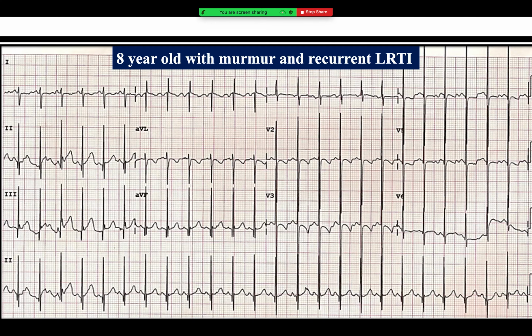It is, of course, congenital heart disease. Isn't it? It is sinus tachycardia. We can see the P waves in front of all of those complexes. Axis-wise, right axis deviation. How are these P waves? Because the patient is in tachycardia, it can be a little bit difficult to say, but right atrial enlargement is there. Yeah. Then by looking at the V1, there is right ventricular hypertrophy, right? Then we look at the V5, V6. What does it further say?